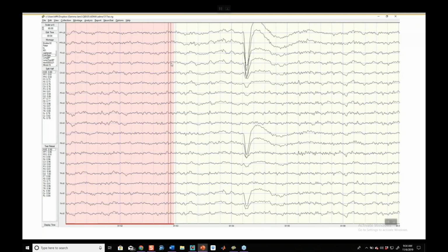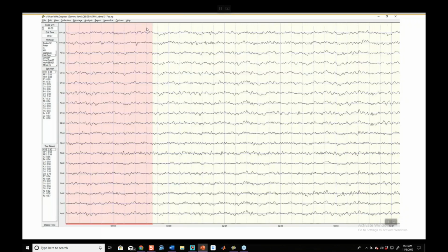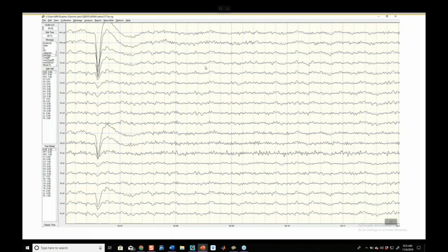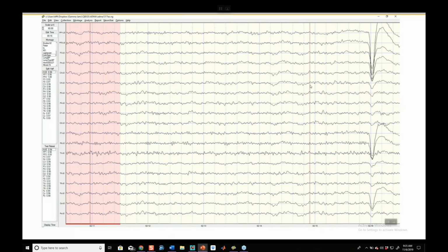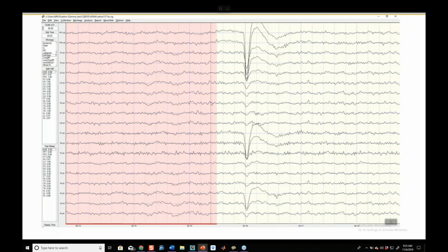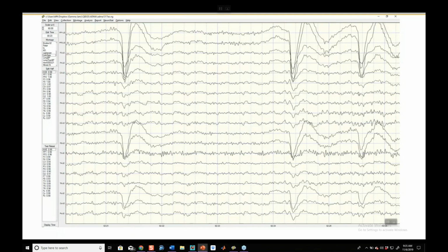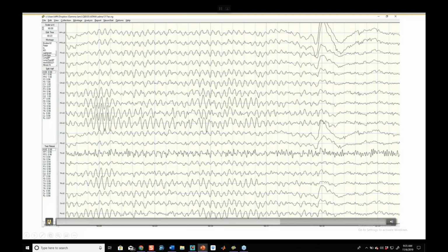In fact, I would recommend that you question frontal delta or any delta in a quantitative EEG. Make sure that it is the real deal, because delta indicates white matter cell death and is generally pretty severe. Now, in this case, I'm not going to get any of the whiplash from the blinks. I'm going to avoid them altogether, and it will produce a nice clean map. It's a general rule of thumb. You want to accept data that is consistent.